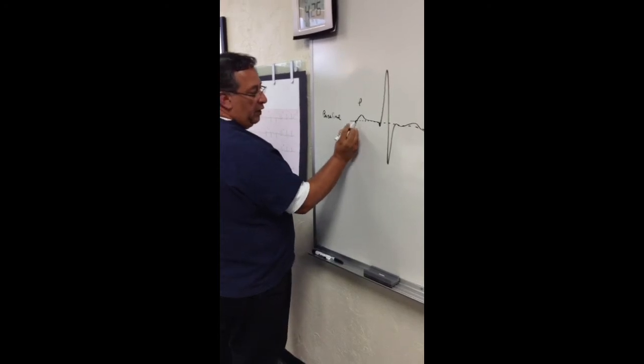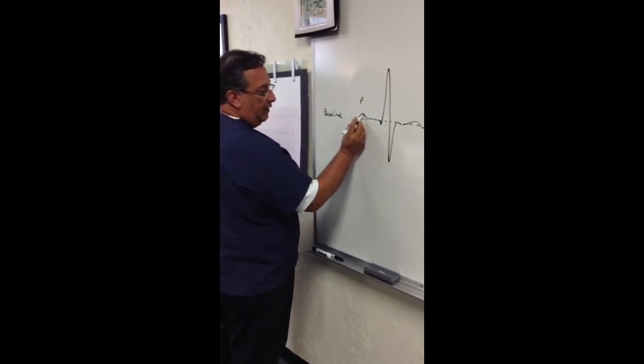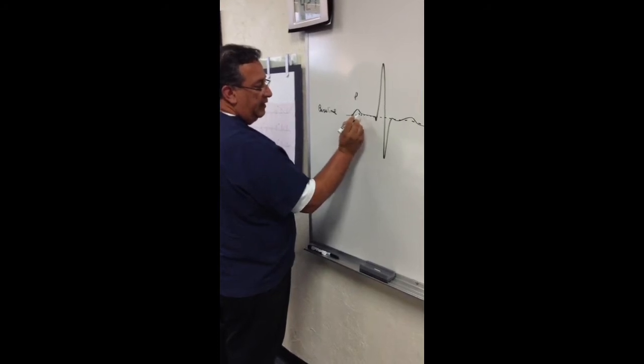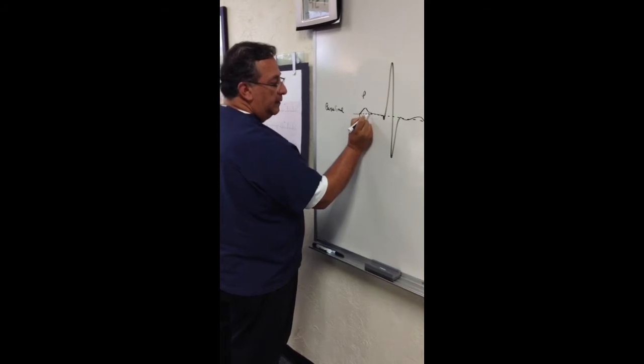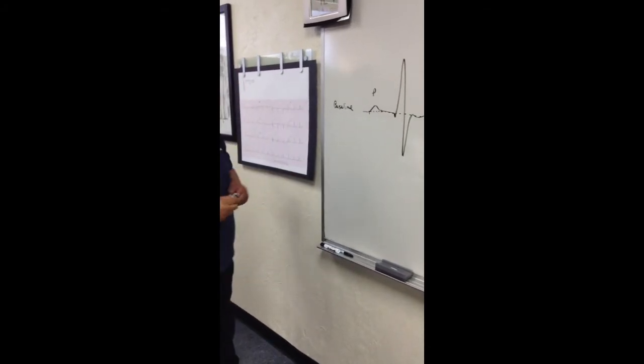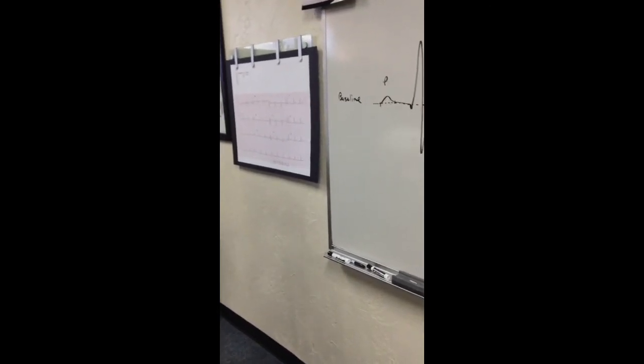And so we're going to start right at the baseline where the P wave starts to raise up, moves across, and then returns to the baseline. So maybe I should move that out just a little bit farther. Okay, so you want to be able to measure directly from where it began and where it ended.